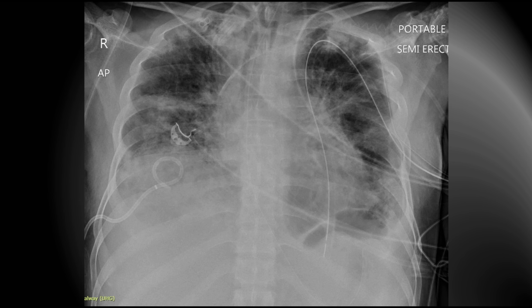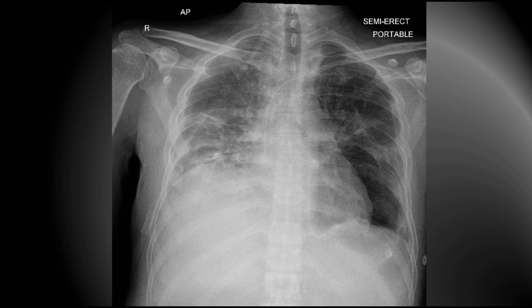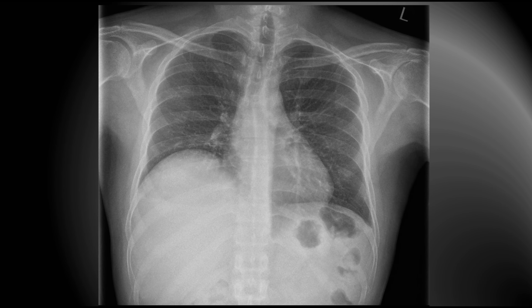By mid-February, this is what the chest x-ray looked like. There were bilateral chest drains. The patient also developed a hepatic abscess, and that drain on the right side is going into a collection in the liver. This is what it looked like in mid-March. And then by the summer, the chest x-ray was almost normal. And this was typical of patients that we saw during the COVID pandemic, and we still see patients with ARDS that behave this way. I'll point out that all of the examples that I've shown you in this tutorial are from patients who survived who gave me permission to use their images.